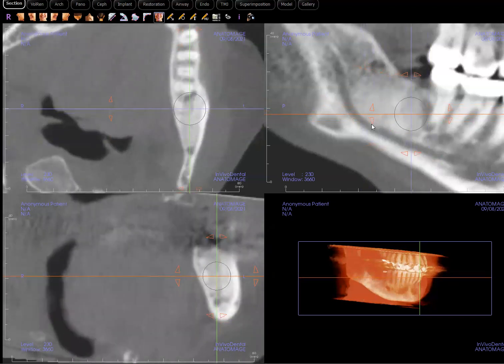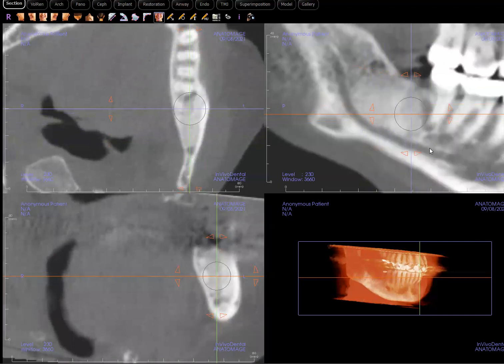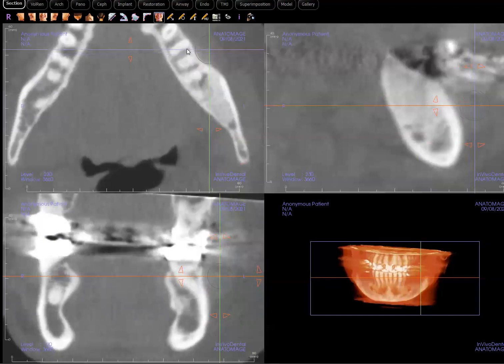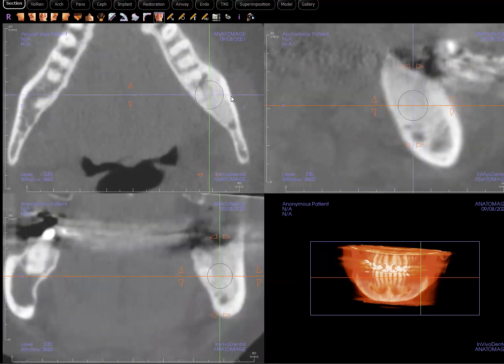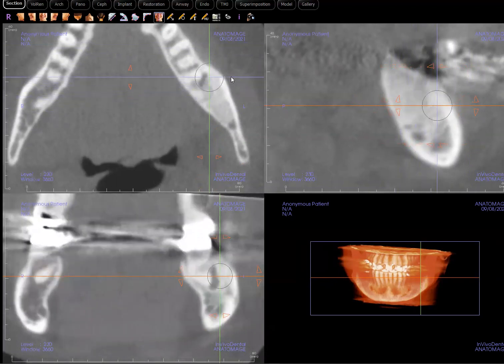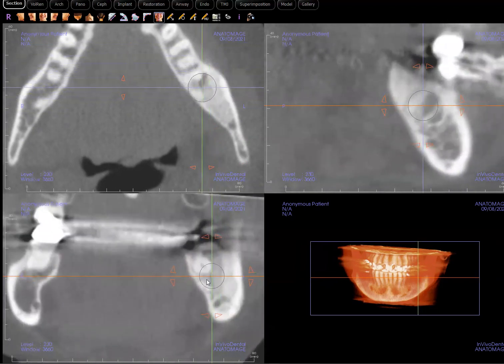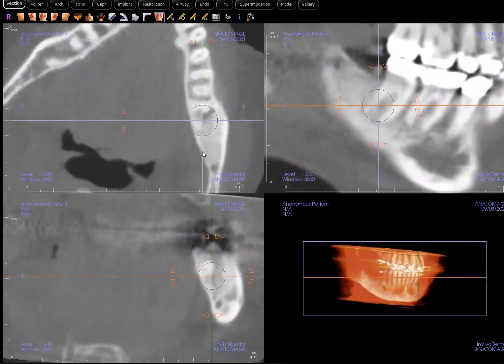And we don't see any evidence of mandibular canal constriction in this case either. And I'll be curious to know whether there has been displacement of the canal. Well, that's the one on the right side and the left side. Not much of change, right? Okay, well, thank you again. That's all I wanted to kind of share with you folks.